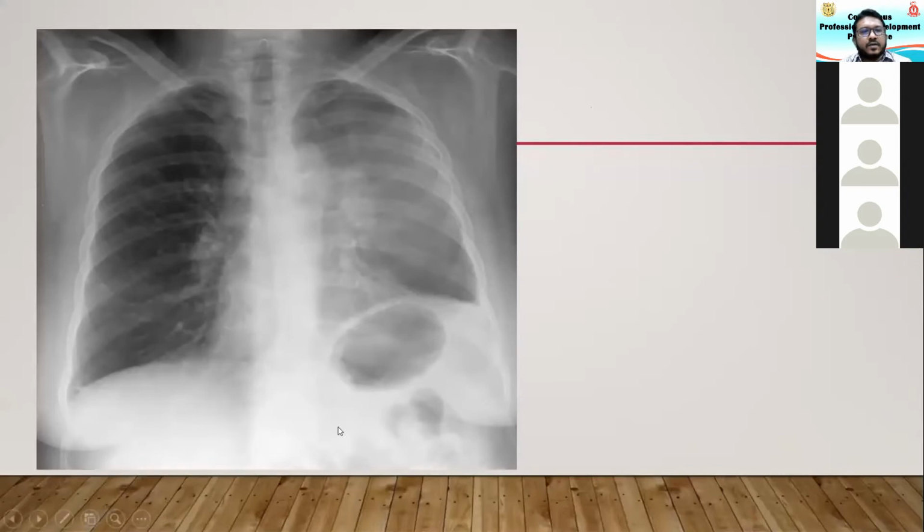Okay, another common scenario, maybe not that common, but in adults, you always have to have, if it is adequately taken, a chest x-ray without any rotation, and if you see both lung fields, you can see there's some opacity, a diffuse opacity, which you call a veil-like opacity on the left side. And you always compare with the right side, then you can see there's a veil-like opacity. There's elevation of the diaphragm, but the outline is intact.